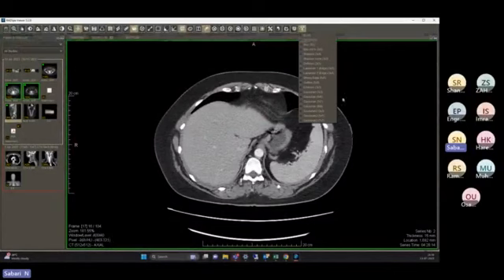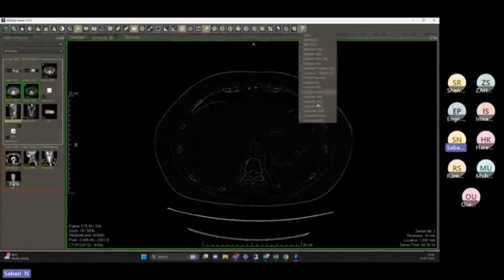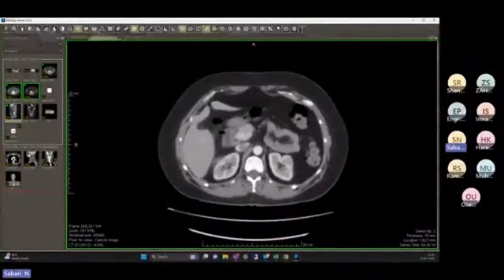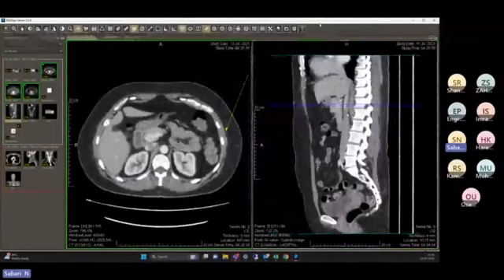Type of window level. So you can see there is blur, blur more, and Laplacian. This and all will be used by radiologists to adjust the images when they are doing the findings. You know, this will be helpful for them. So apart from that, these are the tools which are available in our application.